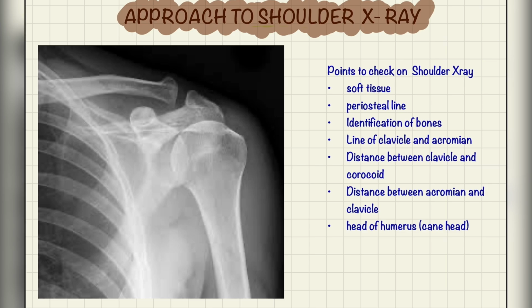So now let us talk about the soft tissue part. Here I am marking the lateral aspect of the arm, and this is the soft tissue area that we are going to look at. These are always grayish in color. If you find any dark black colored structures or boundaries in this area, there can be an injury to either the humeral head or the scapular region.